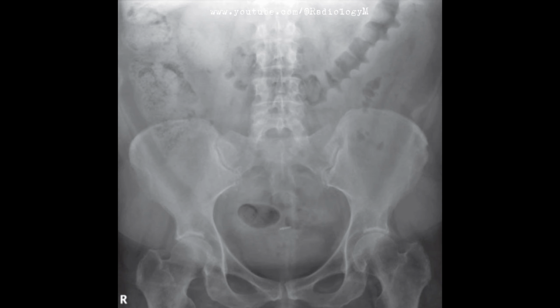There are no signs of bowel perforation, as evidenced by the absence of free intraperitoneal gas under the diaphragm. The cecum and ascending colon appear relatively normal, without significant dilation or gas-filled loops, which is reassuring. The absence of these features reduces the likelihood of complications such as toxic megacolon, which would present with a more severe degree of distension.